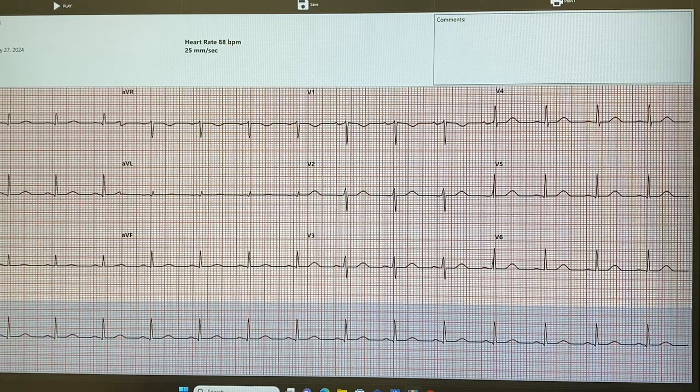Correct. So like this one is a good example. Yes, exactly. So you can just eyeball it. Now you can't tell if they're all the same, right? So now you can march it out again.